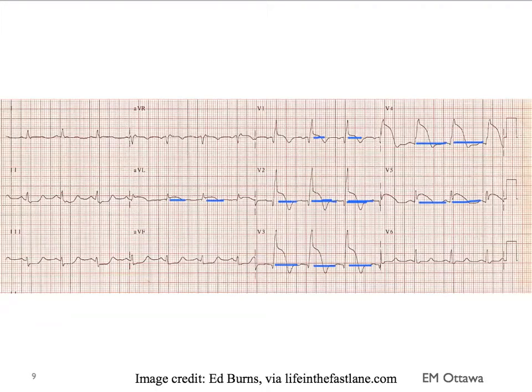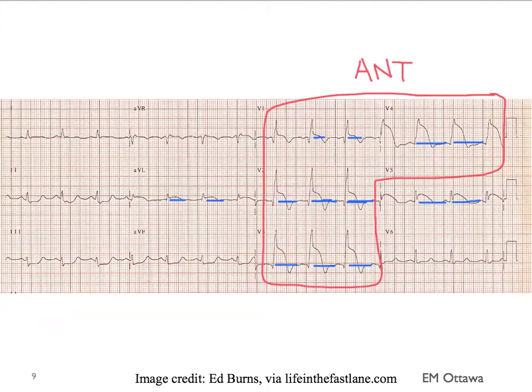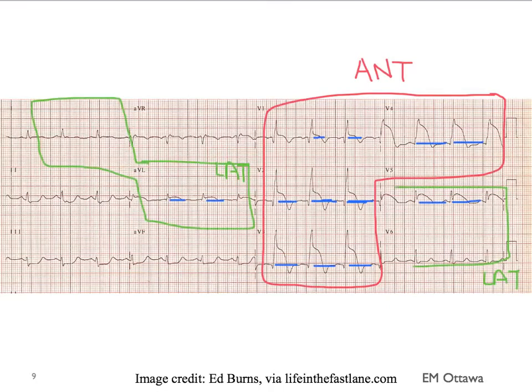So the question is, do the ST elevations belong to the same territories? And if so, which ones? They include the anterior territory and two of the leads in the lateral territory. Therefore, this is an acute anterolateral myocardial infarction.